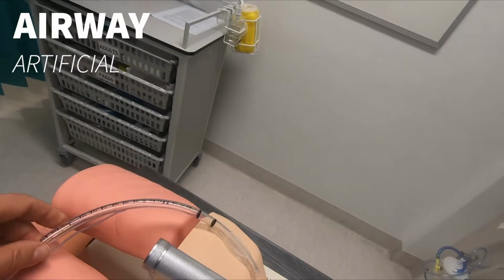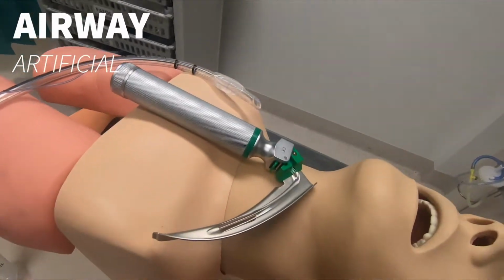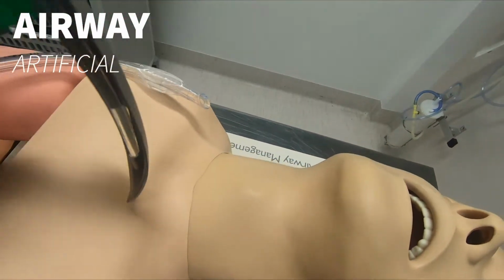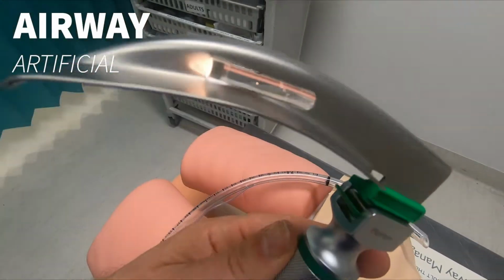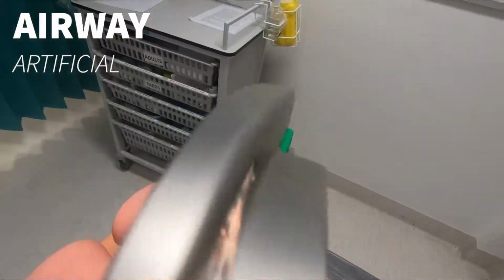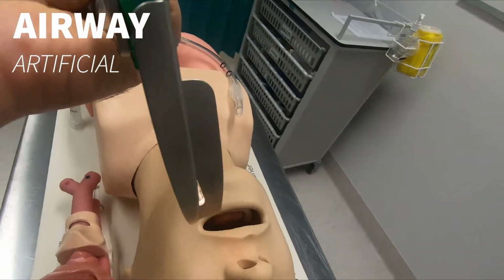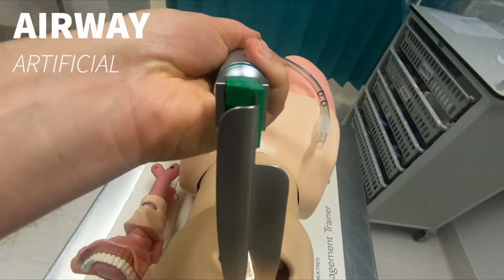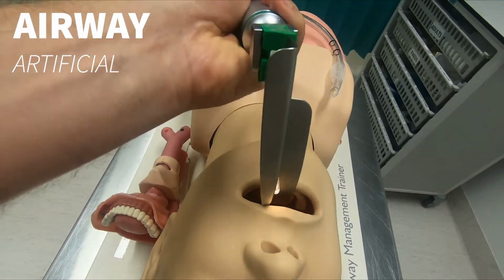To be able to get in the airway with the endotracheal tube, you need to paralyze the vocal cords, otherwise they will snap shut on you, and there's a name for that. It's called laryngospasm, and you need one of these laryngoscopes. So this one has a standard blade. It's a Macintosh, a size 3. Yep, a nice handle, and underneath this will hold that like so. This is a left-handed blade. There are right-handed blades, but I've never seen them being used. Everyone seems to use this one.